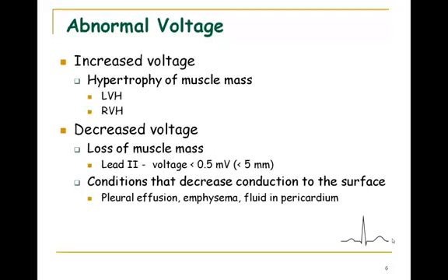But if you see a lot of big voltage, generally over 20, usually 20 to 25 millimeters, which corresponds to 2 to 2.5 millivolts, that constitutes high voltage. You will see that with left ventricular hypertrophy. However, here's to throw a wrench in the works.